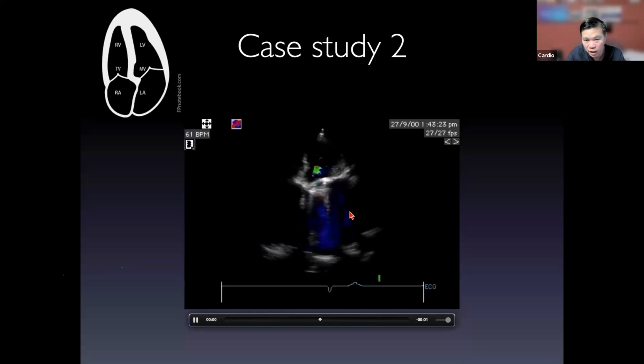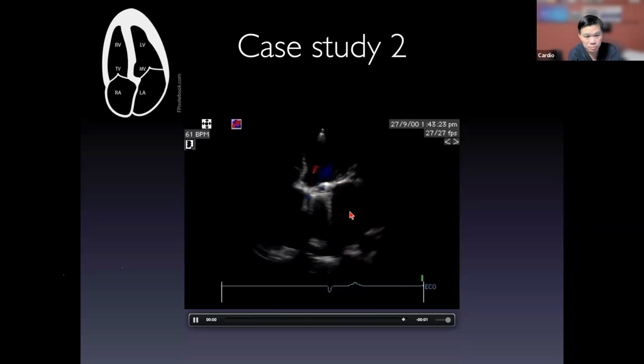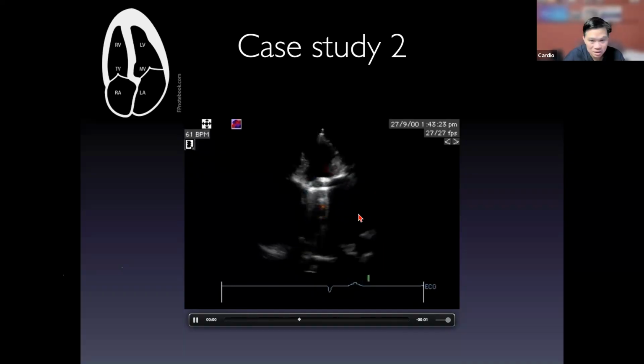Oh, thank you for the mitral valve in the chat. So what do you think about this color Doppler? Is that real? Is this a perivalvular leak? Is that an intravalvular leak? What's going on here? Or is this real? Anyone from the chat? Don't jump in all at the same time. Okay, good, thank you. And this is not real. Good.